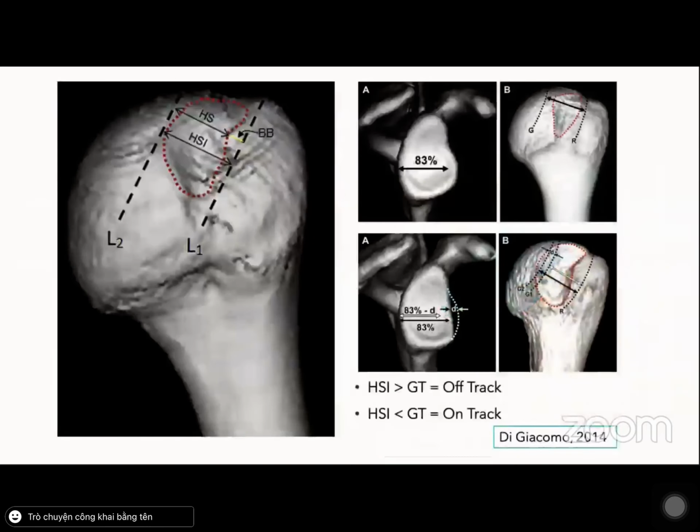Measurements of the glenoid track and the Hill-Sachs interval can be acquired from 3D reformatted CT images. Some studies have also shown promising results to measure these parameters on MRI studies. Exact measurement methodologies are beyond the scope of this presentation but can be readily found in various literature.